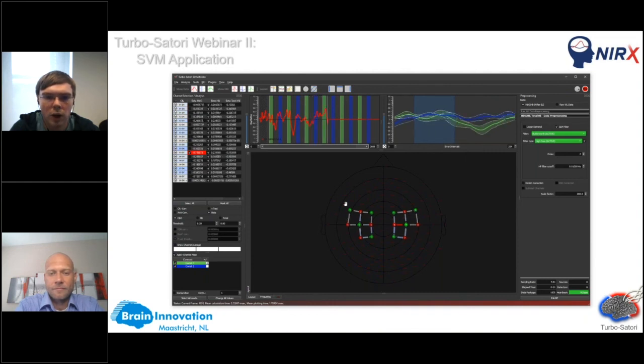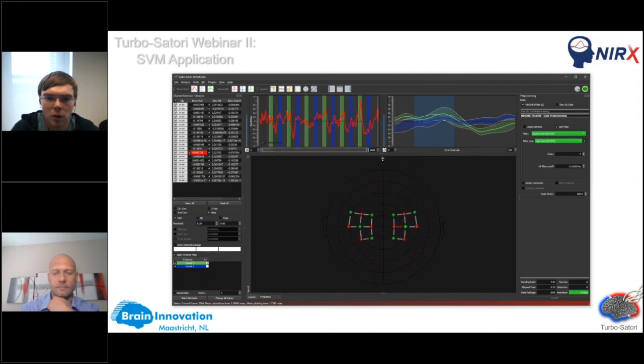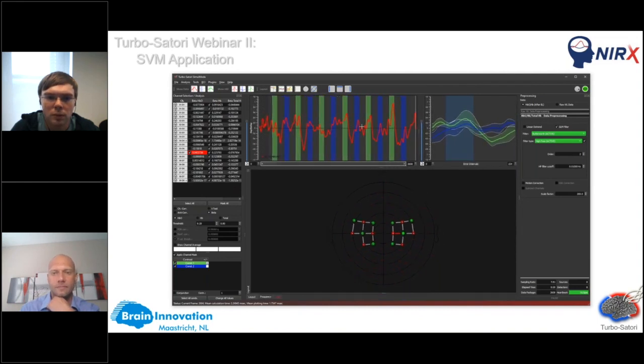We recommend to add a longer rest in the beginning so that the GLM calculations can settle. But with this, you are able to exclude specific information from your data if you need to. And this is basically the case for the specific channels. As soon as there is access to the motion parameters, we will also include this to the confound predictors, and then you can also use this in the GLM filter.